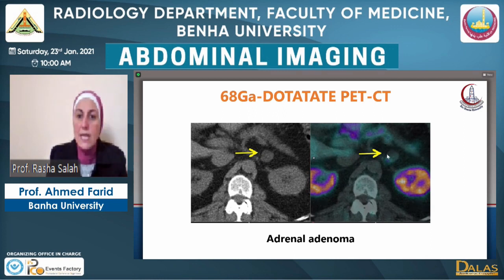Sometimes adrenal adenoma could be misinterpreted on the routine imaging as paragangliomas, and if we perform the gallium dotatate PET-CT, then it will be negative because they are not paraganglioma and they are showing no uptake.